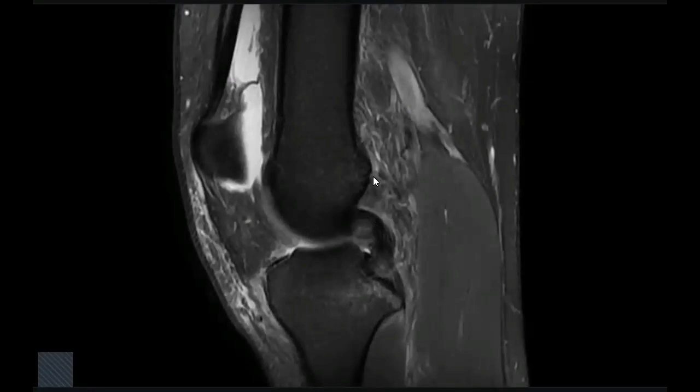This needs urgent orthopedic review, as this patient might need surgical reconstruction of the ACL. Okay, thank you. Well done. Thank you. This is a long case, a common case, and it may also come in VIVA, but less likely.